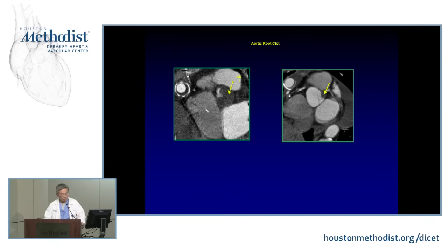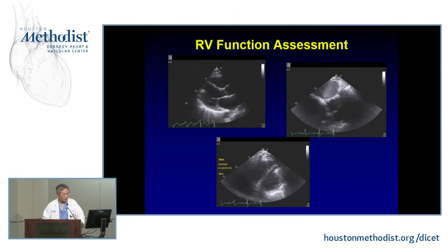And so this is an extreme case, obviously, of aortic root thrombosis, almost involving the entire 3 coronary cusps, and the patient does have evidence of myocardial infarction, but she was well supported, so she did okay. I think she ended up having a transplant. And the right-hand side is just very isolated, a good example of an isolated clot in the left coronary sinus.